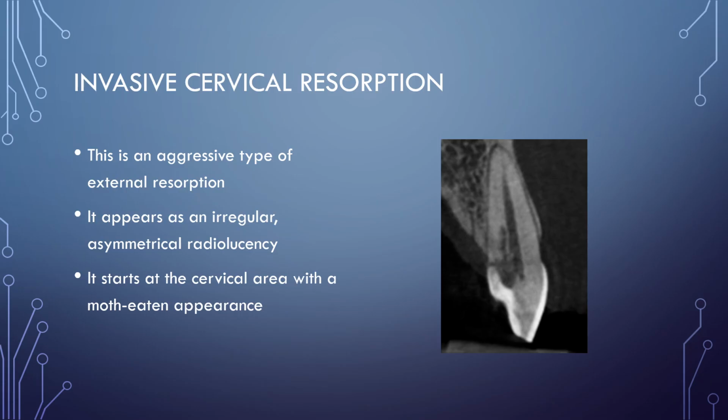A key interpretive step is to trace the defect inward. You will often see it spread widely through the dentin, while initially leaving the root canal space completely untouched. CBCT is absolutely essential here, as scrolling systematically through the slices is the only way to determine the true three-dimensional extent of the lesion to decide if the tooth is structurally restorable.